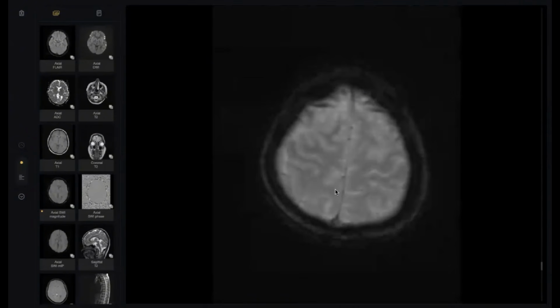On the susceptibility weighted images, there is no blooming artifact, so again these foci are not hemorrhagic. My differential diagnosis at this point: bilateral, multiple, diffuse, deep and subcortical white matter lesions could be infectious given the history of fever. These could be due to some sort of encephalitis.